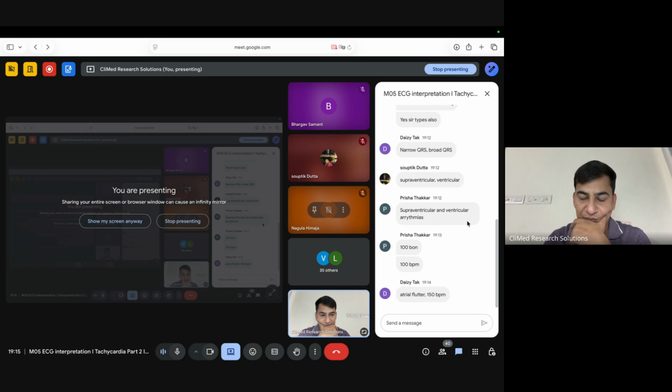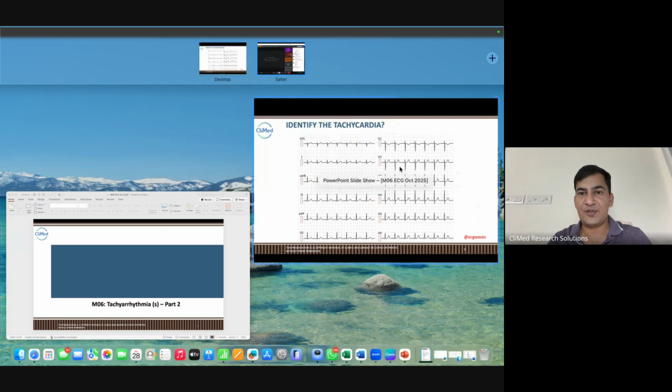Atrial flutter, 150 BPM. Daisy, okay. Anyone else? No idea, guys? Come on. You're studying, right? We have discussed many arrhythmias, right? Then, okay, let me show you again.